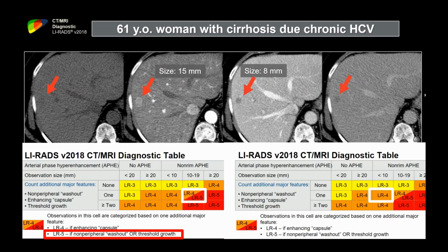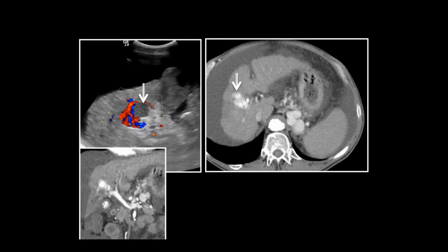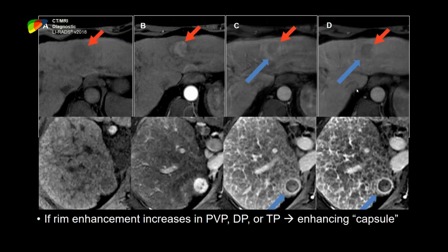This is a great case, by the way, Khaled. Yes. Thanks. But if you revise the MRI case, if we did an ultrasound, I'll show you the case. I think I know what case you're talking about. Yes, the MRI. Yes. Which is this case. So I think if we did an ultrasound for this case, what is the actual size of the observation will be? Oh, very interesting. Okay, so wow, you're asking an amazing question. Okay, so what's the real size of this lesion?